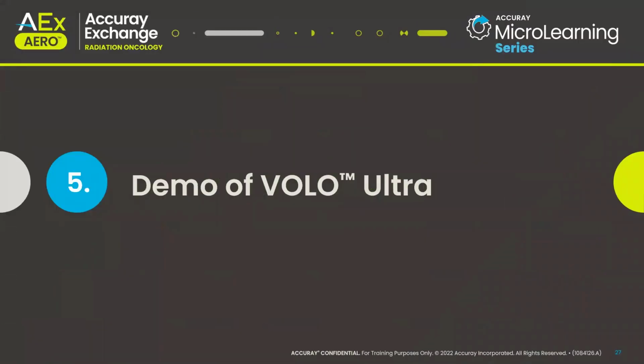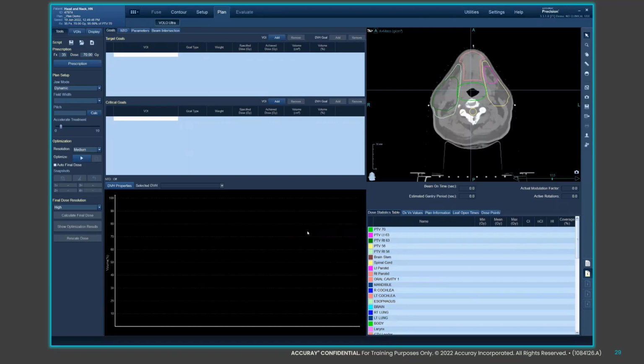Okay, so you've heard about some of VOLO's new features. You've seen the potential improvements that it can provide for your plans. So to finish this session, I want to move on to the demo portion. Okay, so let's walk through a plan so you can see VOLO Ultra in action.